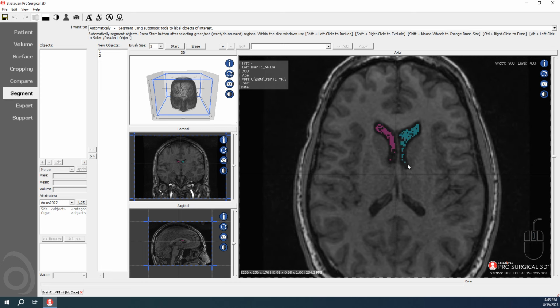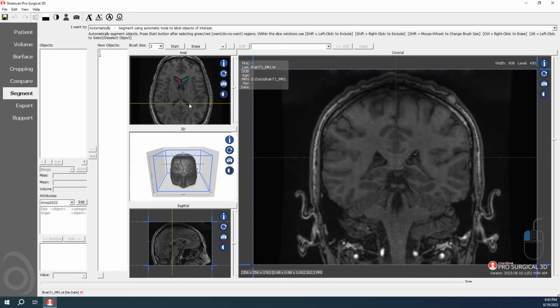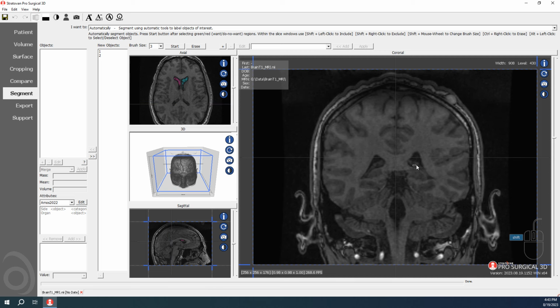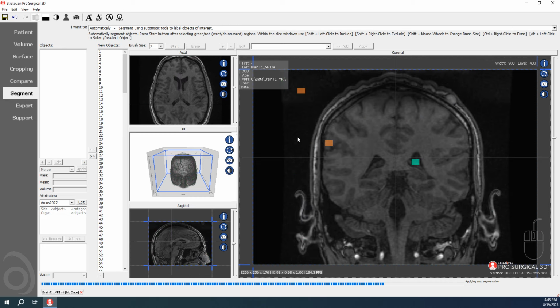And you can also provide information in the different views. So if we have one more down here, we can put a box there. Captured too much. Let's tell it to not get things out here.